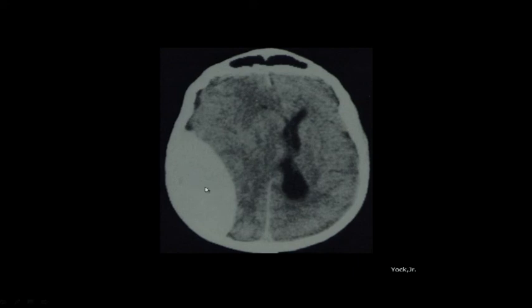And these are going to be venous or arterial? Arterial. Is this an emergency? Absolutely. Can an epidural cross the midline? Yes. Can it cross sutures?